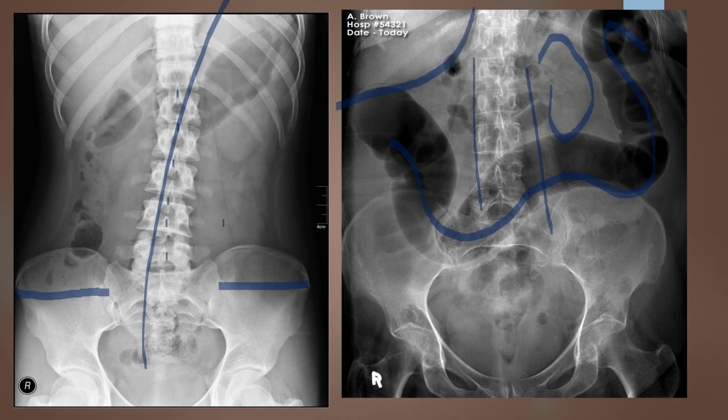So really, if I look at it, my contrast resolution is pretty phenomenal on this, even though at first glance it didn't look that great. I'm going to look at soft tissue detail and bony trabecular pattern. We kind of looked at the soft tissue details. So now let's look at the bony trabecular pattern, and I have good penetration through the thickest part. I do have good cortical outline.